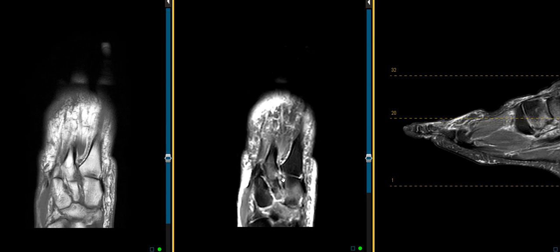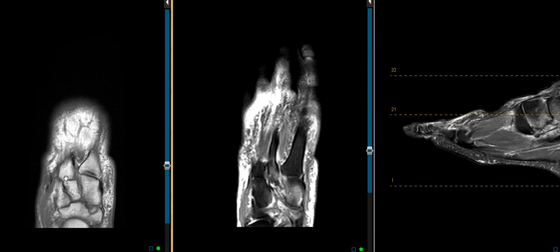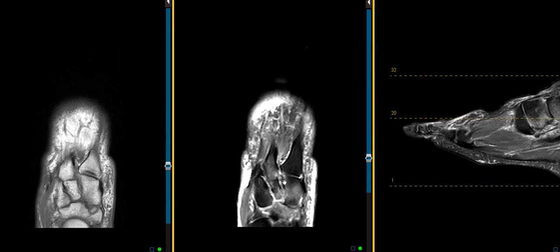This is very serious because the Lisfranc ligament holds the second metatarsal base in position. When this is torn, this can drift laterally. You can get a midfoot dislocation. These bones here will drift out to the side. It can be a really devastating injury. Right now, there's no significant subluxation or dislocation of the midfoot, but this is a critical ligament, so you need to be able to recognize this for sure and know that this is a hot spot to look at.